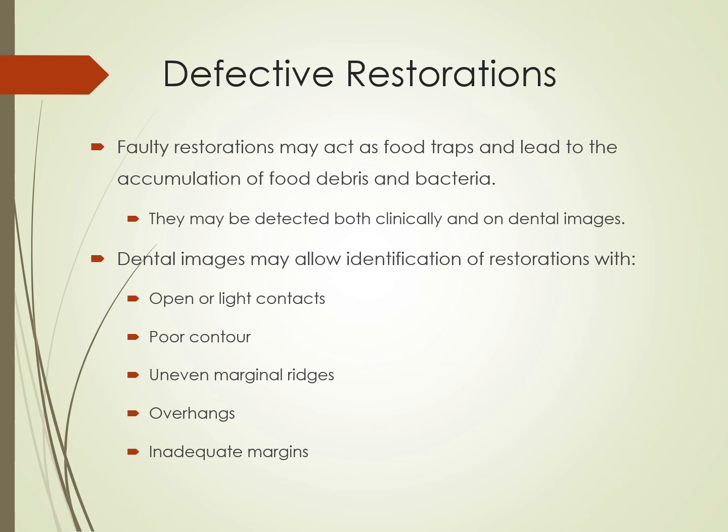If the material sticks out further than the tooth does, then it will trap food underneath it. And then inadequate margins are when a crown goes onto the tooth, but the margin of the crown doesn't go all the way down to where the prepped surface of the tooth is. So it's considered an open margin, and an open margin gets food stuck in there, of course.